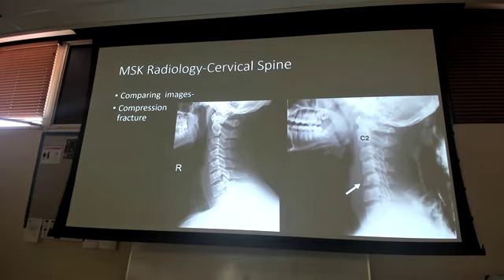Don't have it here, so I don't have a way to name it, because really this line, if I were to take that vertebrae and draw it where it's supposed to be, my anterior cervical line is good. It's where it should be. I'm imagining as if the bone was there. We'll look at that with the lumbar.